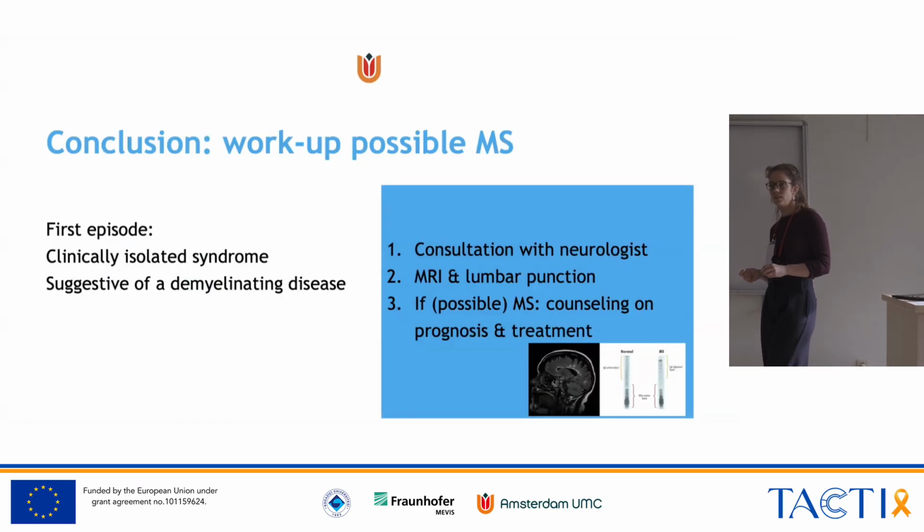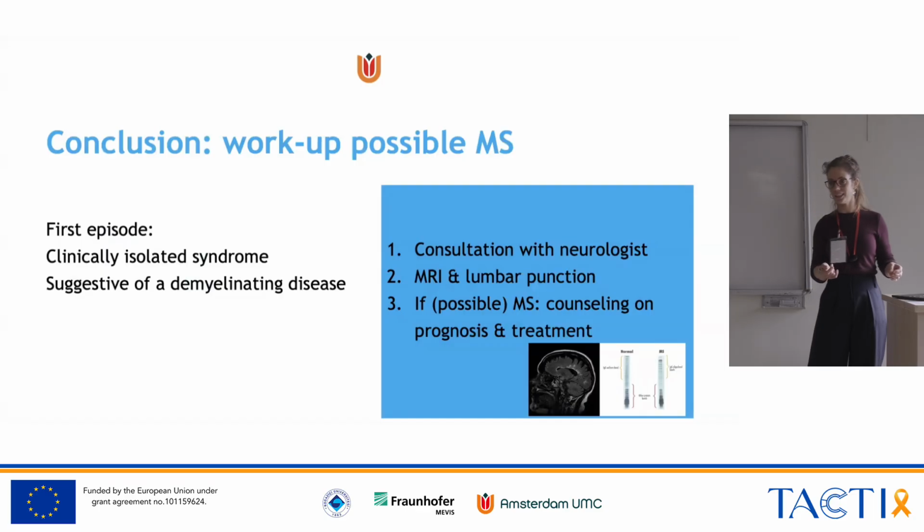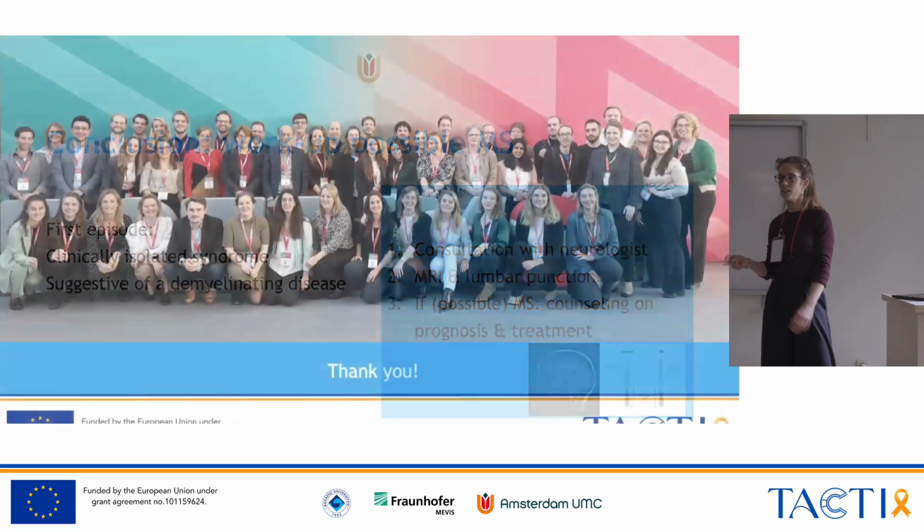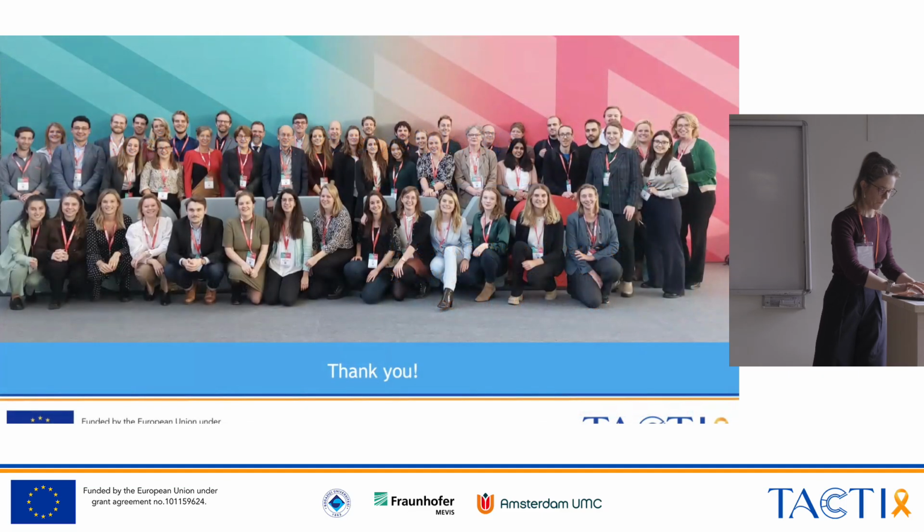Any questions on this? And I say it's sometimes difficult to see the lesions, but it's also difficult to make a mistake in the diagnosis, and that is what we will be discussing in the next lecture on how MS mimics can also make life quite difficult. Thanks.